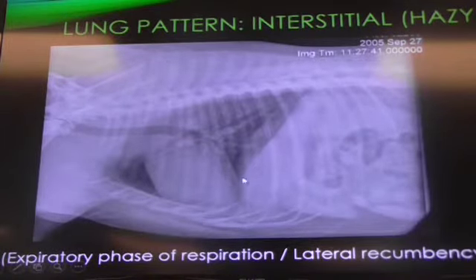If the diaphragm and caudal margin are coming together, it's usually expiration. This is expiration. Another factor that adds to it is lateral recumbency, because we just discussed the side which is recumbent will be more collapsed. So some haziness is due to collapsed alveoli on the recumbent side.